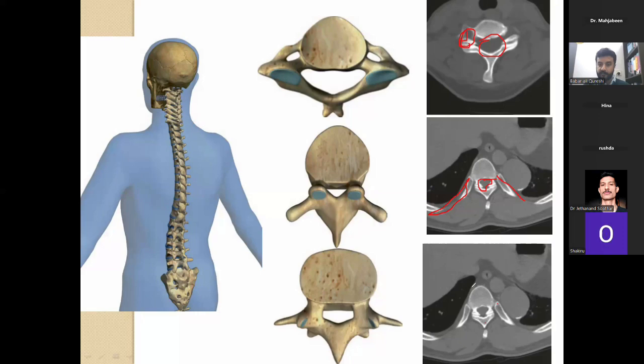I have taken it twice. So here you will not find the rib. This is the same picture that I have repeated mistakenly. But in the lumbar region, we can see the canal would get large. The transverse processes would be shorter as compared to the dorsal spine, and the canal would be bigger.